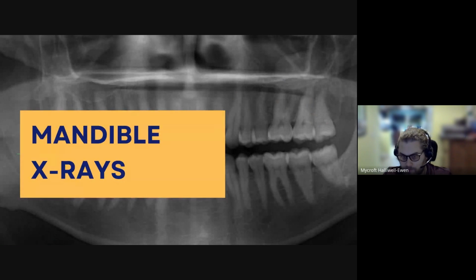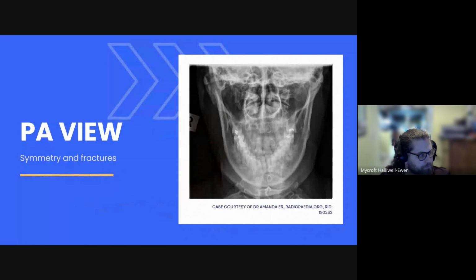Yeah, this is starting to get a bit more clinically relevant again, right? So full disclosure, I'm not a dentist, right? Okay, and as we know, medicine and dentistry are two entirely separate, and never the twain shall meet, right? But we have a couple of different ways of looking at the mandible itself.